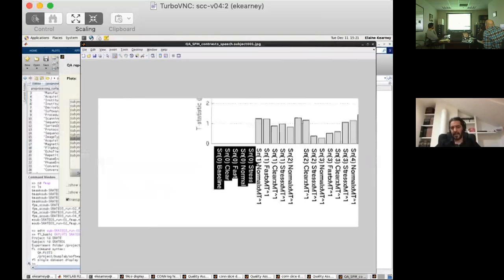This is a sparse acquisition, right? So there is no overlap between conditions. So then, yes, those are exactly orthogonal. So it's probably just motion. That's the only thing that can be correlated with these values that is not almost by design orthogonal to it. So it's probably just telling you that this is more correlated with the motion parameters.